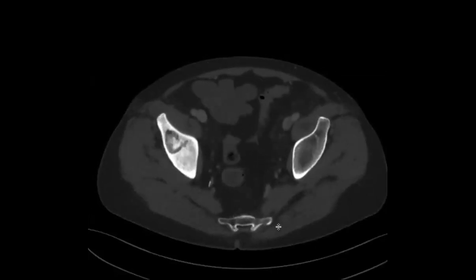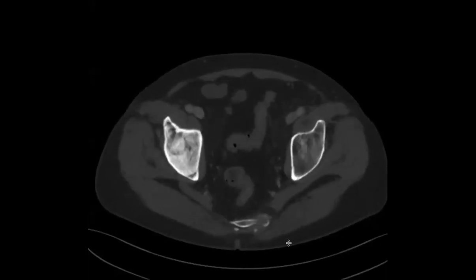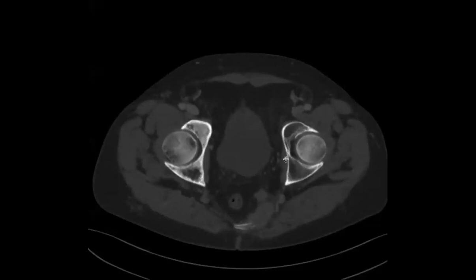So given that they were doing so well on treatment, this scan shows not only that the primary has increased, but there is increasing soft tissue within an osseous met. This was biopsied. And any guesses what this might have come back as?